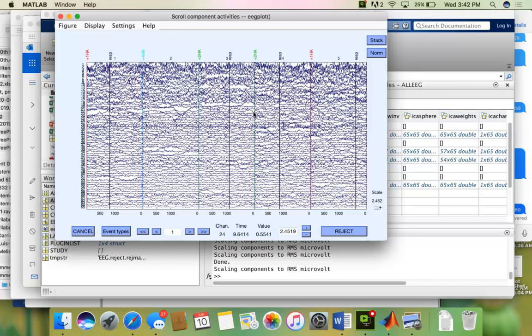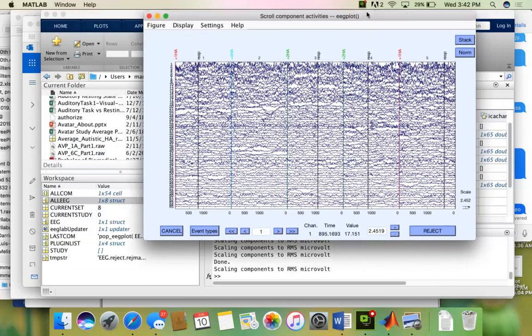If you imagine doing a rectangular window and then concatenating data sets that are rectangularly windowed, at the boundary you're going to get some odd stuff showing up in the Fourier spectrum. Okay, so now let's also plot the head plots.